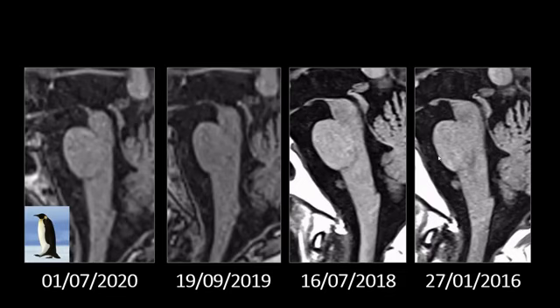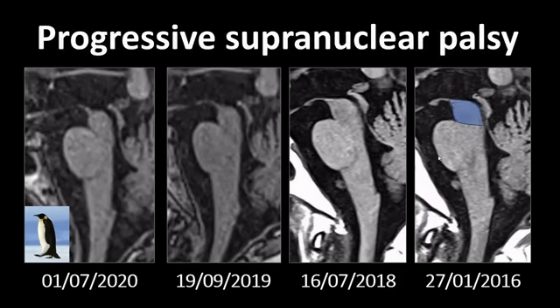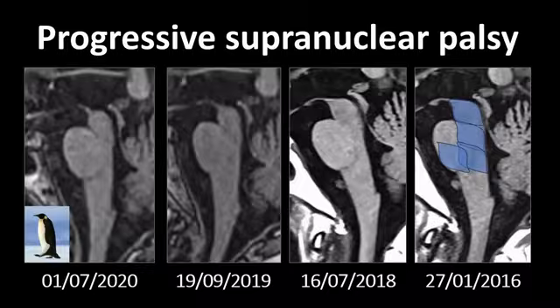In a normal situation, your midbrain fits about 4 times in the pons. So a normal ratio is about 0.25. You could measure that on midbrain sagittal images, or you could just eyeball it and try to figure out how many times it would fit in there.